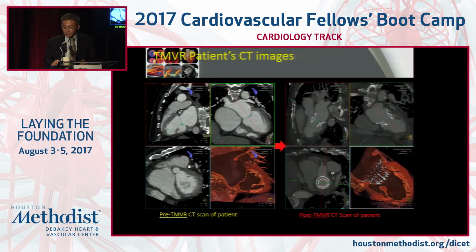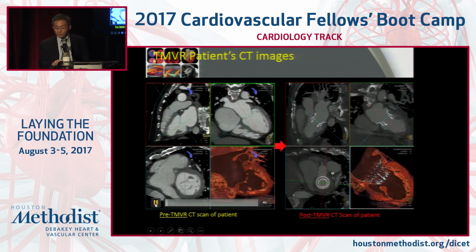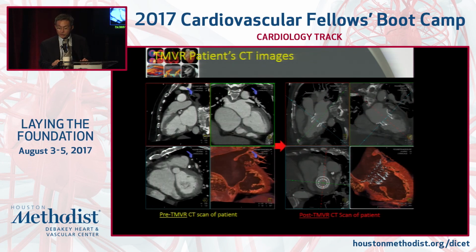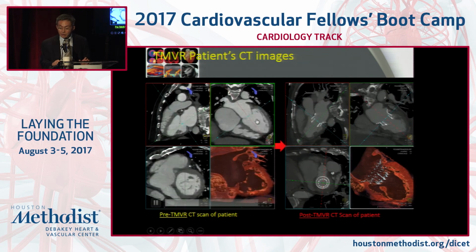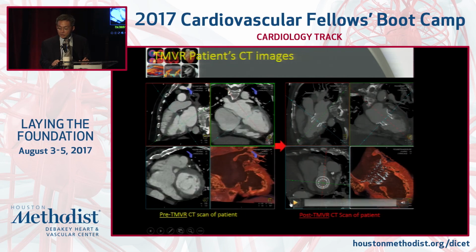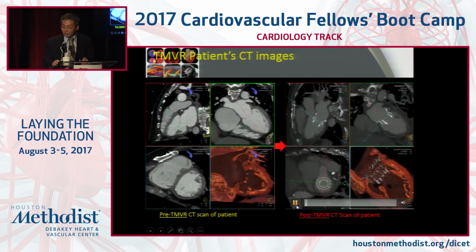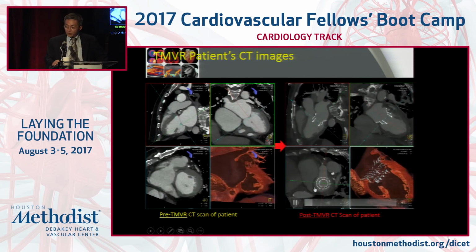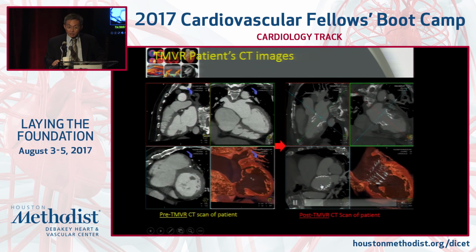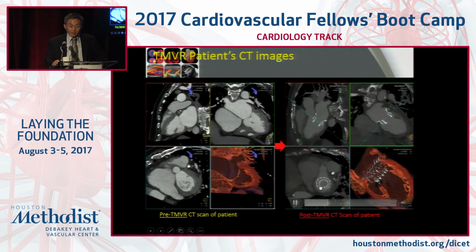And I think this is the most exciting application, to use the CT to understand how the prosthetic valves that we're putting in patients function. This is a patient undergoing transcatheter mitral valve replacement, before the procedure. Very large heart, dilated annulus, significantly large annulus, and this is after the deployment of the valve. As you can see, the most important thing, it allows you to assess how this valve prosthesis behaves throughout the cardiac cycle. Okay, this is extremely important for design of the prosthesis.